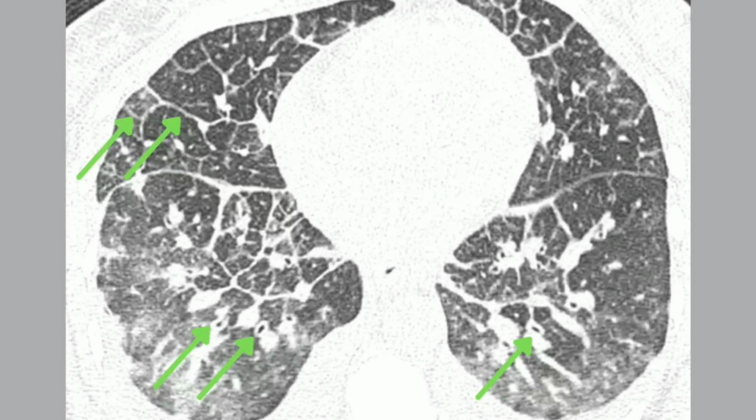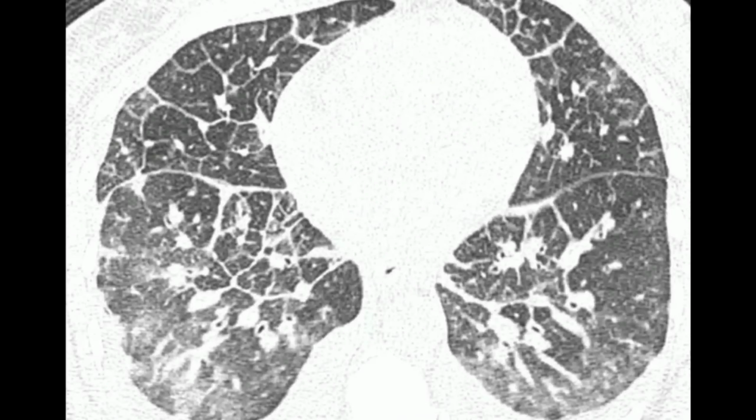The vessels also look larger than usual and probably have wall thickening as well. However, a CT with contrast would be required to better evaluate the blood vessels. In the next lecture, we will discuss the general approach to reading chest CTs and spatial distribution of disease.